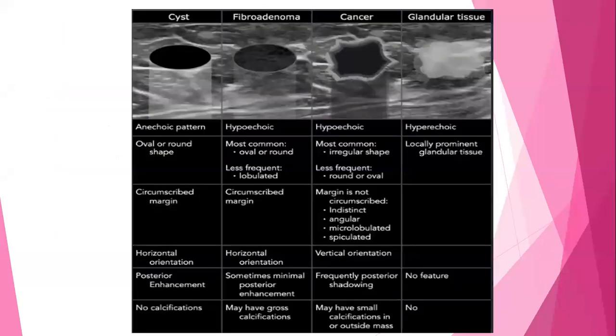So I have several images here, just showing some different findings you may have on ultrasound. In the first case, we have a well-circumscribed lesion. We're seeing good margins and posterior enhancement. No echoes internally, so it is an anechoic mass. So this is a simple cyst. Usually these ones don't require much intervention. They're the ones we typically give BI-RADS 2 to.